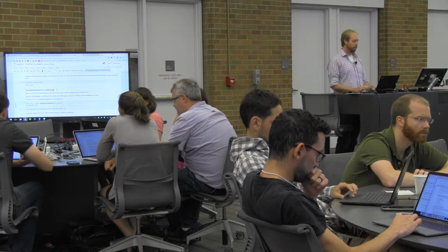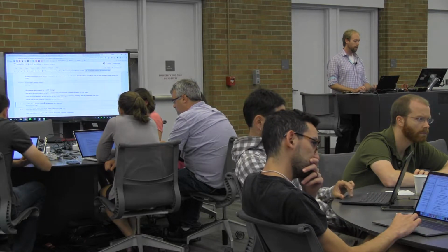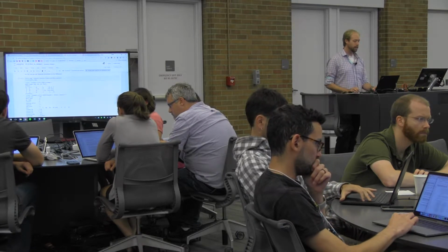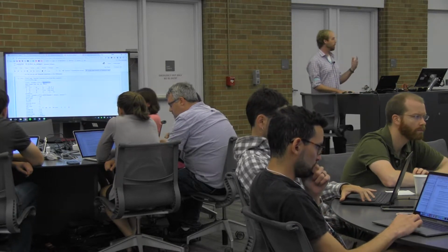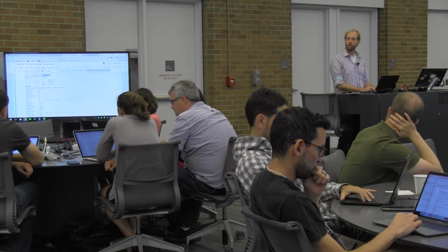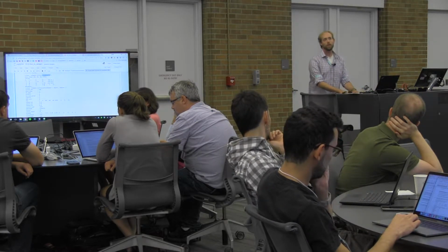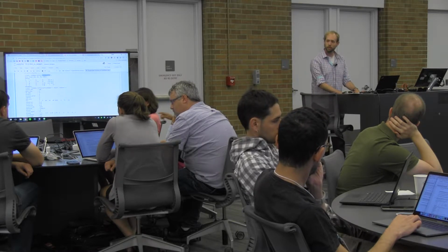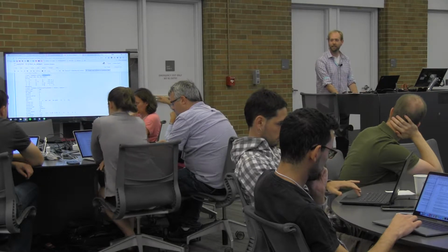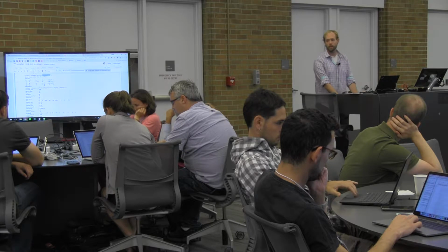So if you remember, fMRI masked is a 2D array. If I use the inverse transform method with that array, then the output is a Nifty image. So it's turned my 2D array back into a Nifty image. So it's basically doing the masking operation on the array, not on the image, on the vectorizing. The inverse thing? No, the masking, sorry. I took a little bit to get started. So the masking operation that it did, it did it on the vectorized portion of the image, not like the whole.